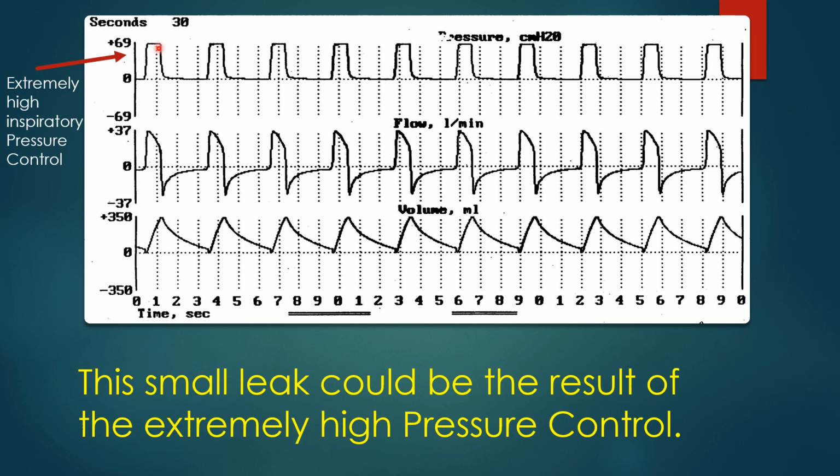This patient has a pressure control of 69. And we would never do that today. These waveforms here were generated back in the 1990s before we learned about lung protective ventilator strategies.